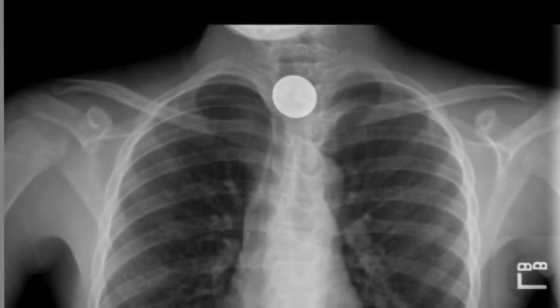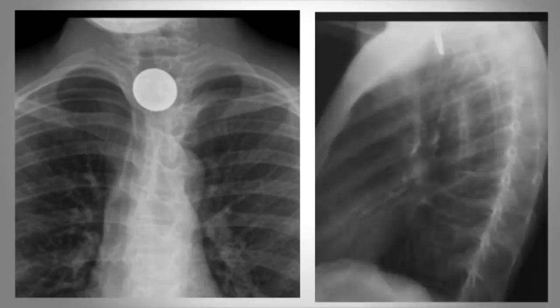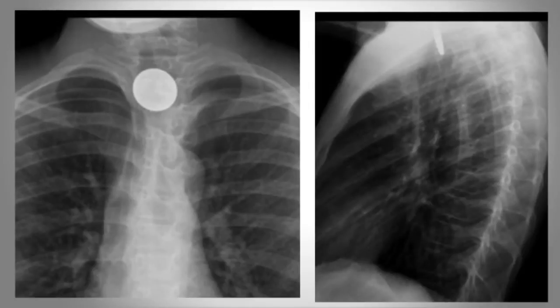Here is a chest radiograph of a young patient who has some discomfort in the neck. Shown here is what looks like a round metallic opacity. Is that metallic opacity a disc, or is it going to be a sphere? To determine this, we need to get another view. From this lateral view, we can now see a radiopaque line. This object, round and thin, has to be a disc, most likely a coin. From the size of it, it looks to be a quarter.